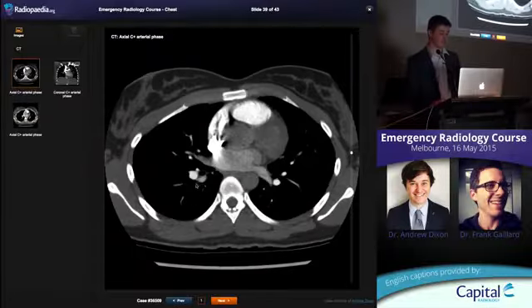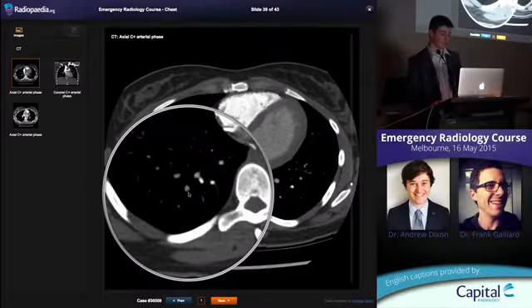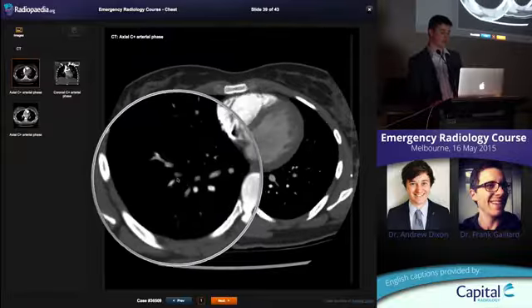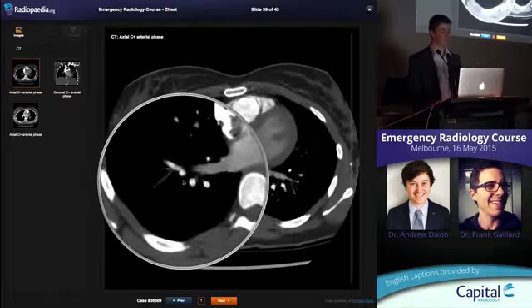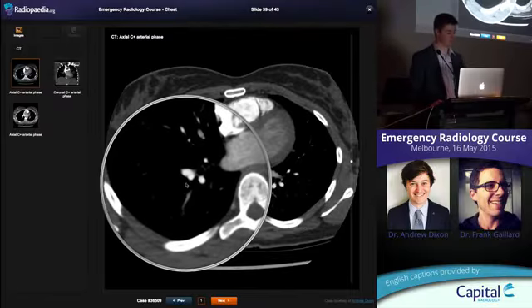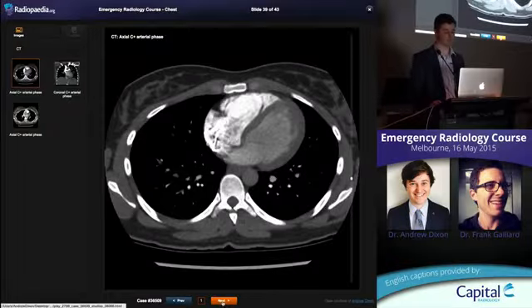In this one, you need to follow it down, okay? And then appreciate that here, there's some good contrast in the vessel here. Next slice, dark, okay? And then when we're going this vessel here, here it is, it's about to branch, nice contrast in it. This branch, dark. This branch got nice contrast going into it, okay? So significant, because if you find these small PEs, they're going to get treated. They may be about to have a large PE, okay? That's why CTPA is an important test, but if you don't have correct timing, if you have a motion artifact or the timing of the contrast is off, you really can't detect those subsegmental level emboli.